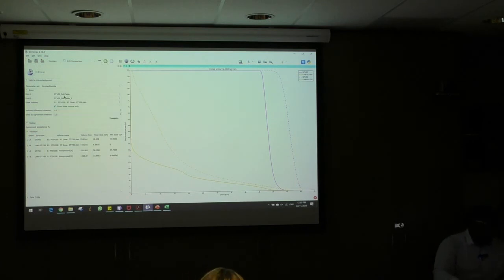the workflow is you select the two dose volume histogram data tables you want to compare, and then you select the dose volume as a reference to use for the computation, and then it will give you an agreement percentage. This is just comparing the numerical values in the tables to try and give a quantification of the similarities between the dose volume histogram data.